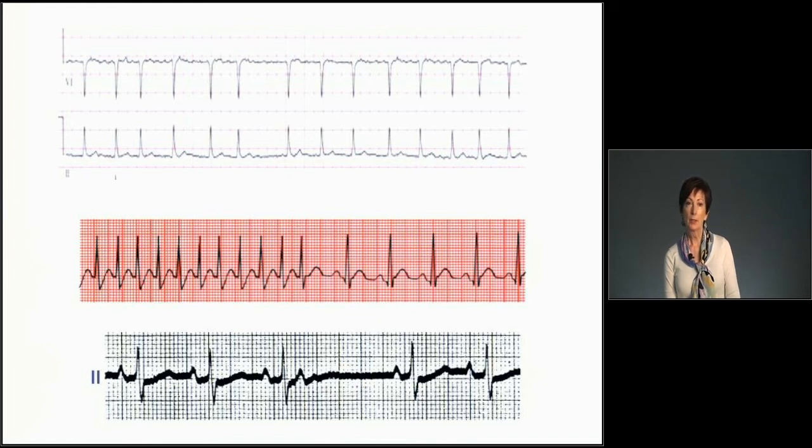On this one, the top strip is atrial fibrillation. The second one is a paroxysmal atrial tach. If you can see the beginning or the end, then you can identify and use the term paroxysmal, PAT. If the strip is only tachycardia, then you don't know if it's persistent, incessant, so you just have to call it atrial tach. Now, if I only saw that first half of that strip, I would have to say just SVT.